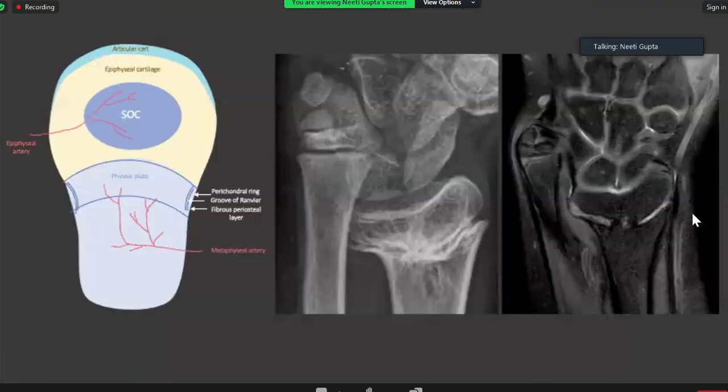Now, we saw quite a few physeal plate injuries. Now, why are these injuries important? The vascular supply of the pediatric long bones is very peculiar, such that the supplying vessels do not cross the physeal plate in normal individuals. In case of physeal injury, neovascularization and vessels develop across this physeal plate, which can predispose to transphyseal bridging.